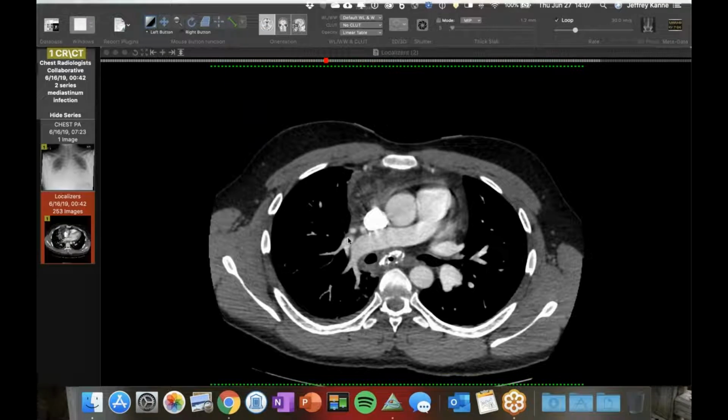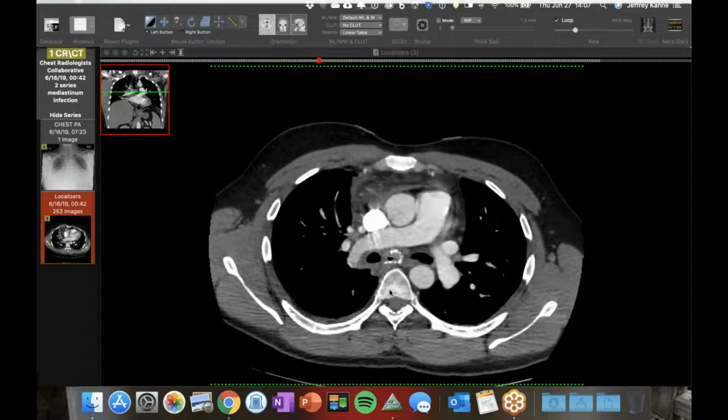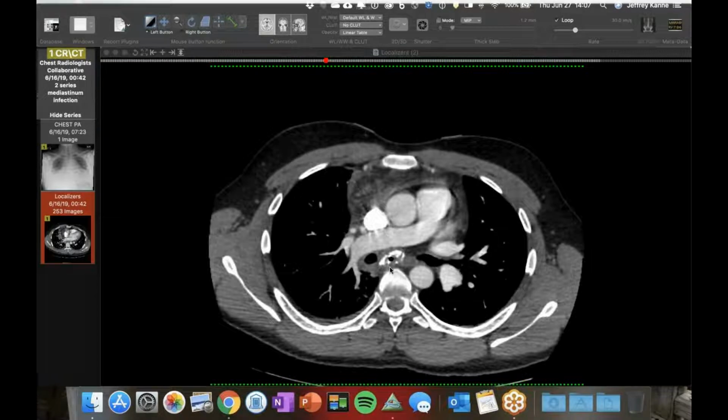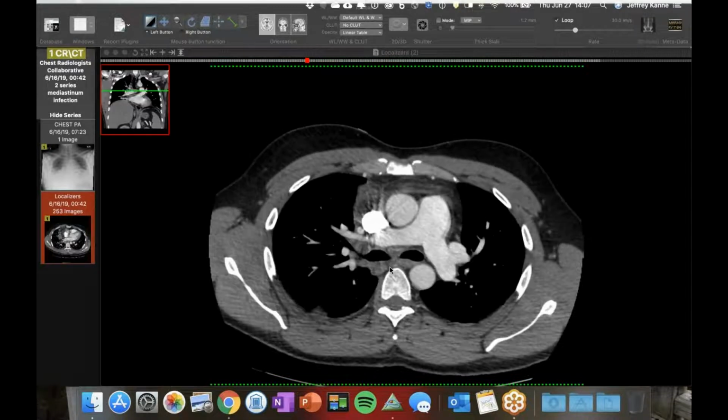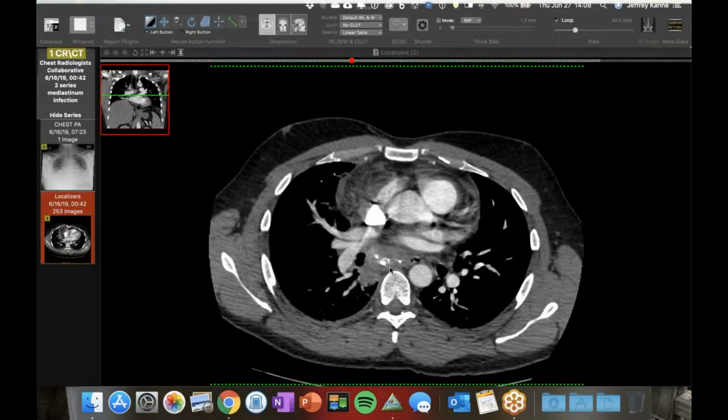I mean, it could be. It's very rare. He's not immune suppressed. What's that dot of gas in it? Yeah, that's the striking thing, that's presumably why it got super infected. It's almost like a lymphadenitis on a background of... I was going to say, it's almost like a bronchus or something, but you don't see the communication. No, and I think they bronched him and didn't see anything either. Huh. So, yeah, it's just odd.